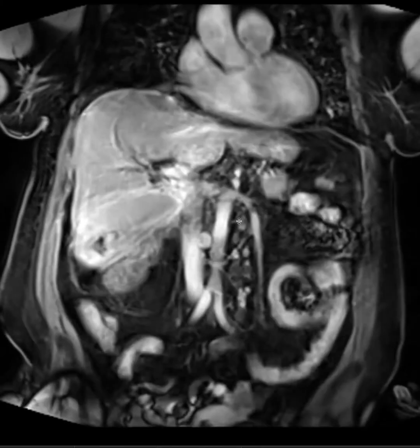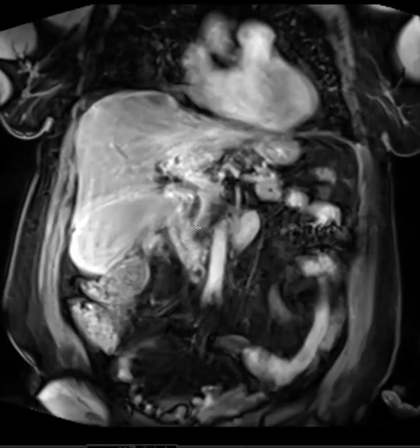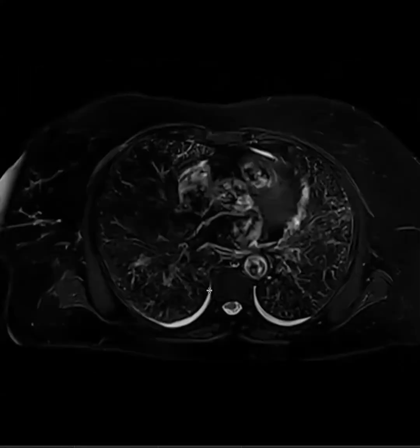And the bile, I think the MRCP, here, let me give you the MRCP. So the ducts are gone on the left. So all that T2 intermediate signal is ductal, periductal. And there's lots of biliary ductal dilatation. Can you show the segmental T2 HASTE again? Yes.